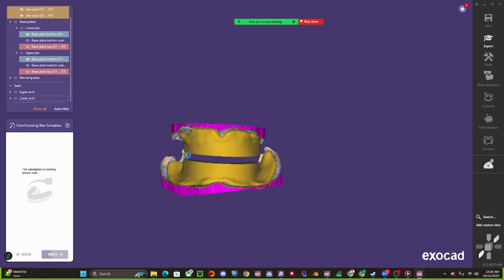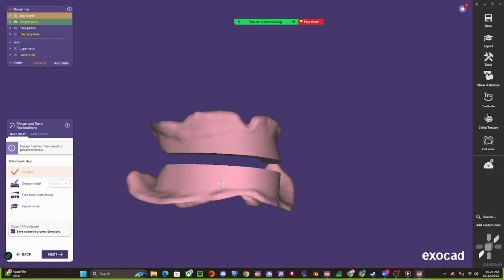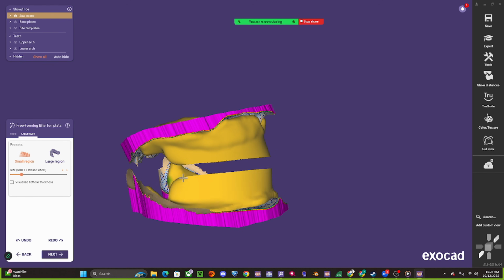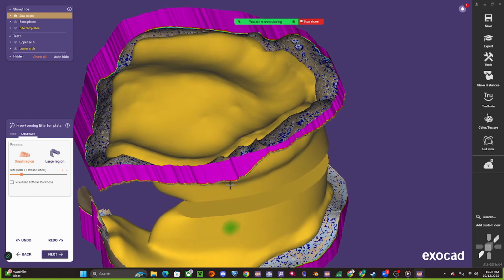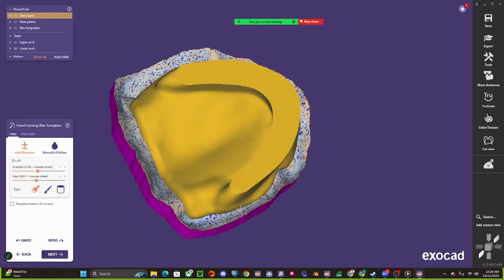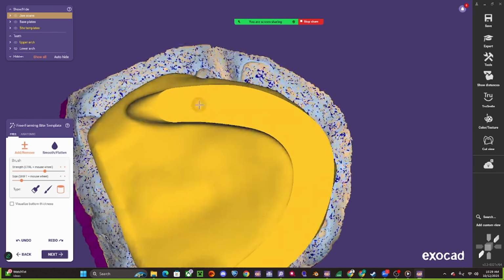Now we have that space for the wax in between, and then it'll merge the design here. I know there's no notches in between here, so we can either freeform the merge, or we could go back and we can pull a little notch here. So like, I want to make sure that it'll bond in here nice. So I'm going to just mark, remove a little square.